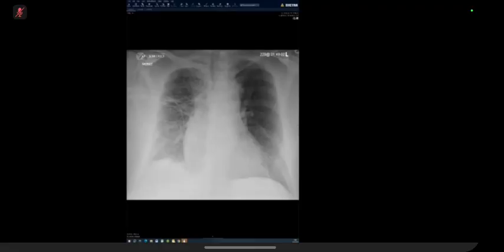This is a frontal radiograph of the chest of a patient who is in heart failure. I see that there's no pneumothorax, pneumomediastinum, or pneumoperitoneum. There are multiple external leads and midline sternotomy sutures are seen. Then looking at the lung fields, there are prominent vascular markings. There is cardiomegaly, there is unfolded aorta.